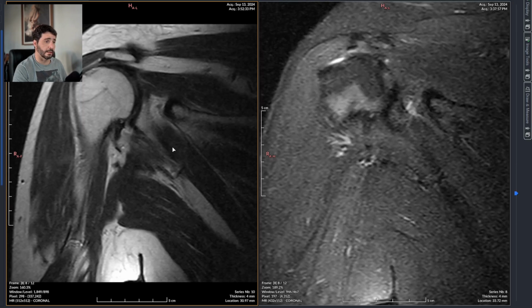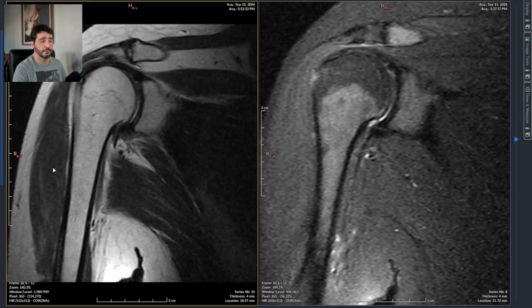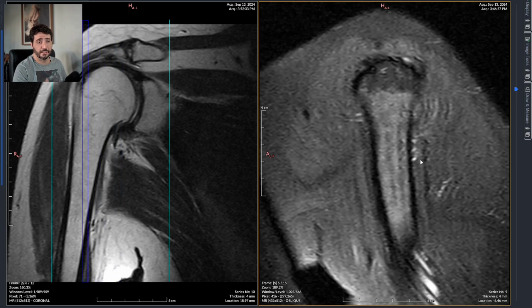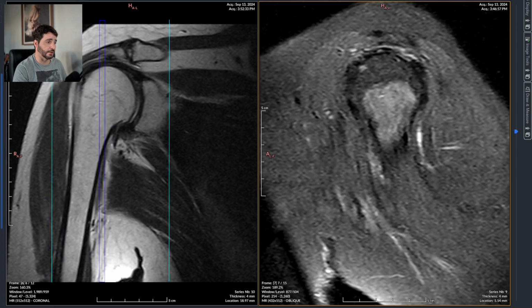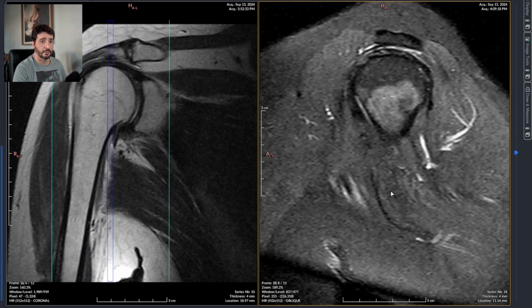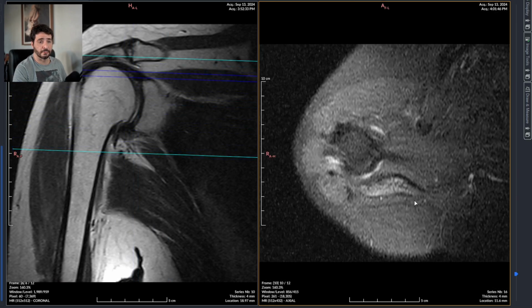So you guys can see this is an obese patient. She was in very much pain. She couldn't hold still. So we have a lot of motion artifacts, which is very bad, but I guess we can make a very useful diagnosis from these images. We don't have to send this image back to the clinic. We are going to report it and we are going to make sense of this very poorly done exam.